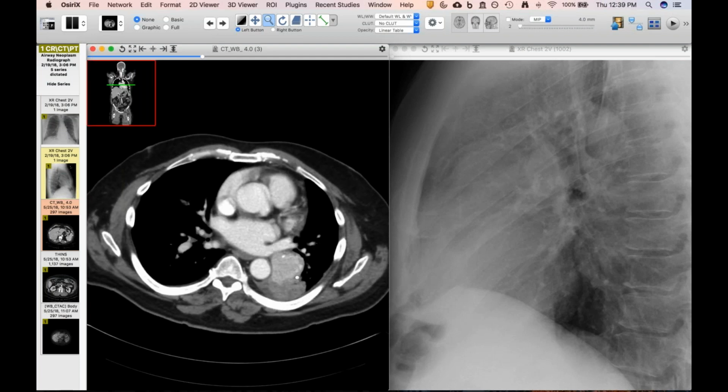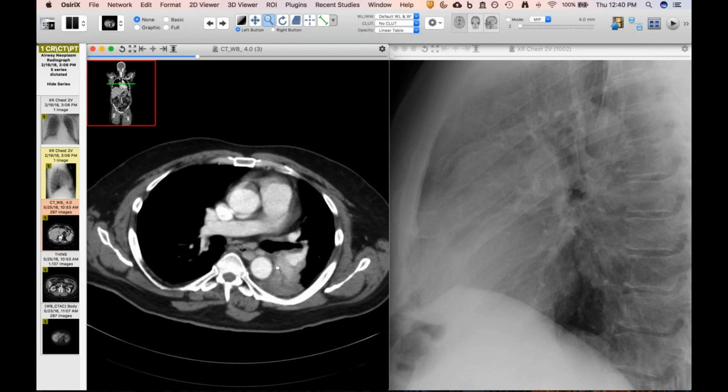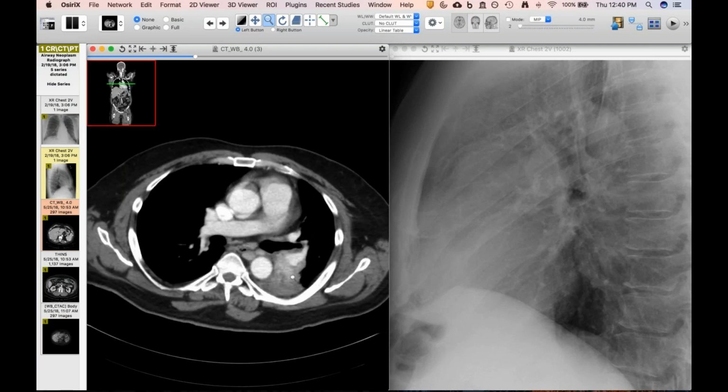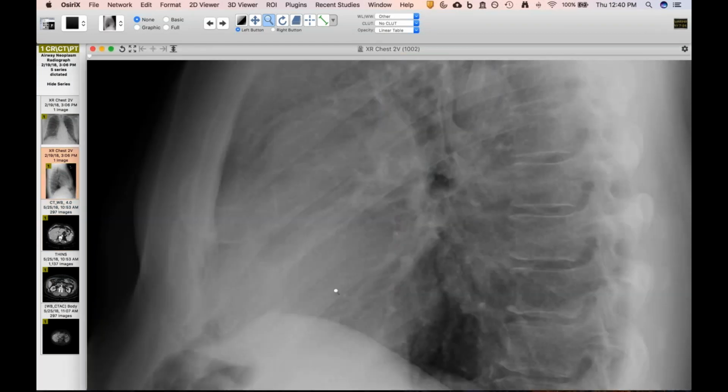And then the patient underwent a left pneumonectomy because of the location of this, and it was confirmed as an atypical carcinoid, not a small cell, but just a good July case with typical left lower lobe collapse and a nice, good look for a carcinoid tumor. You said, I think in my experience, carcinoid? Sorry, David? Travis, it was atypical, not typical? It was atypical carcinoid. Yeah.